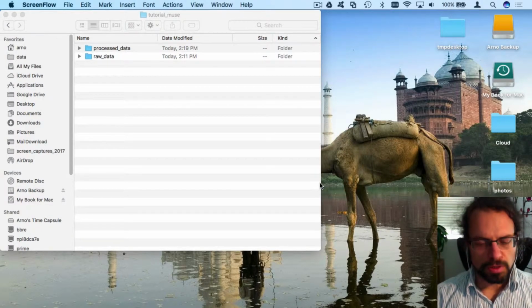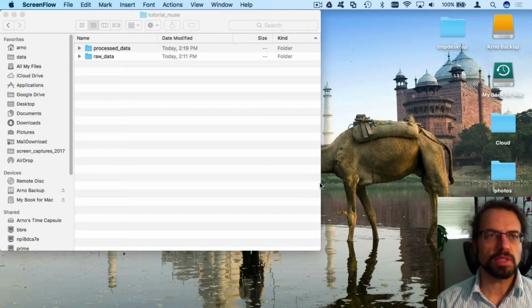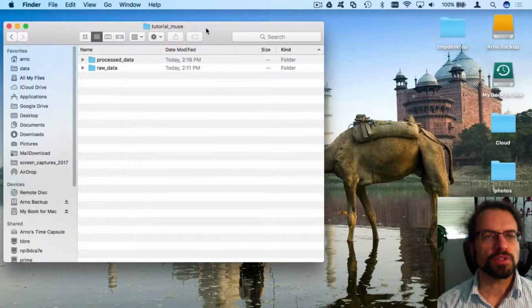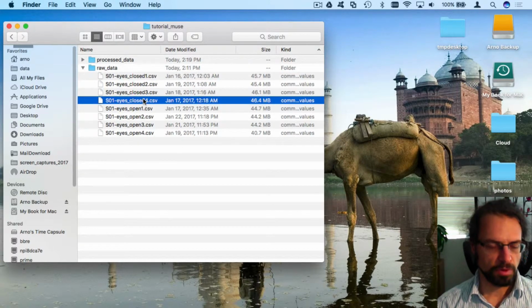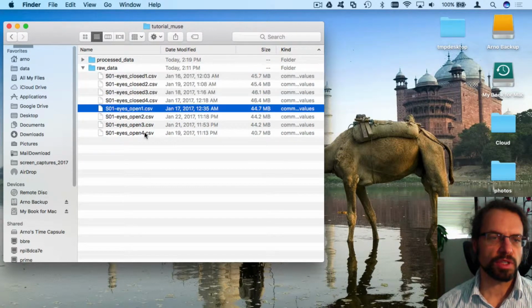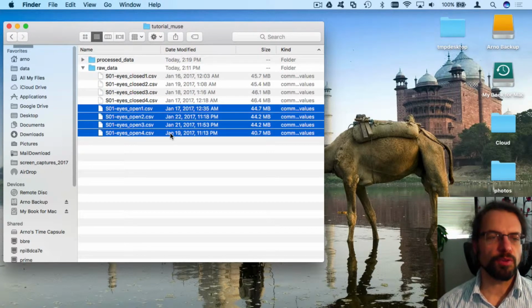Okay, so we're going to start to process these Muse files, and I've organized here some of my files, which I recorded in one folder. So here you see I have recorded some data, eyes closed, I call them eyes closed, and some eyes open. And I have 4 files for each condition.